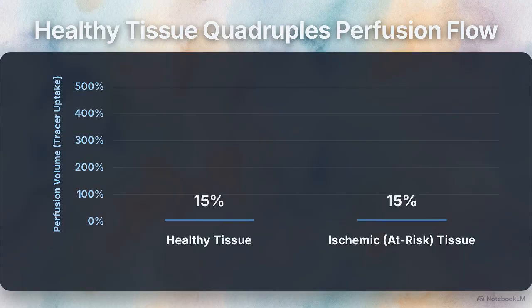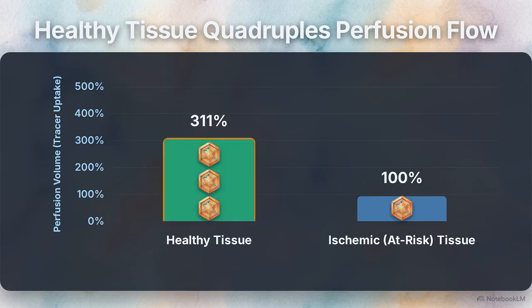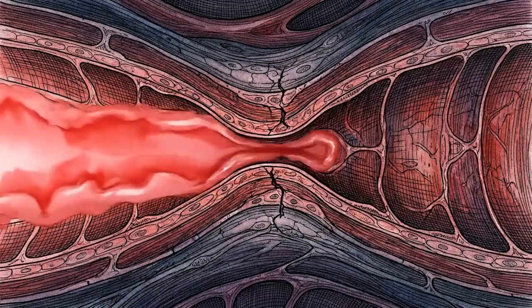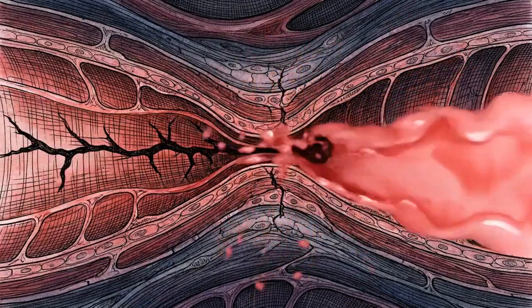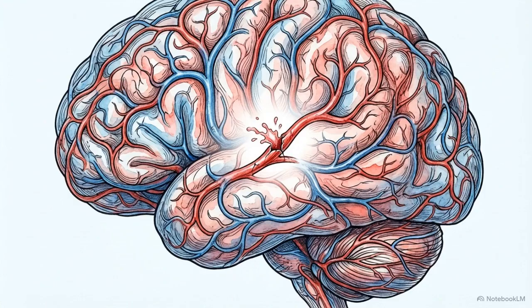Normally, Diamox triggers a 3 to 4 times increase in perfusion. Areas that fail to increase flow appear relatively hypointense on the scan. These dark regions represent tissue operating at maximum vascular dilation just to survive, completely lacking reserve capacity and at high risk for ischemia. By actively manipulating cerebral blood flow, either through exact temporal mapping of a seizure or chemically stress testing the vessels with Diamox, we expose the hidden vulnerabilities in the brain's vascular network.